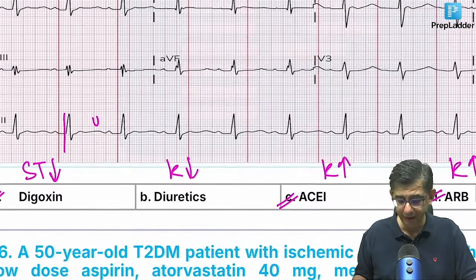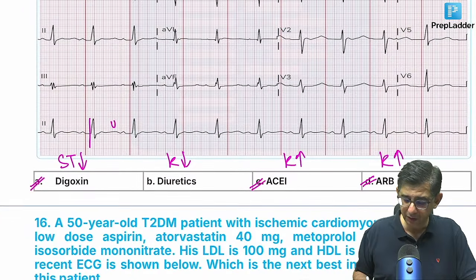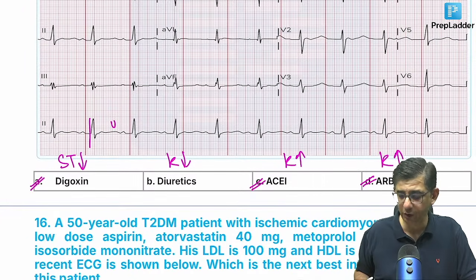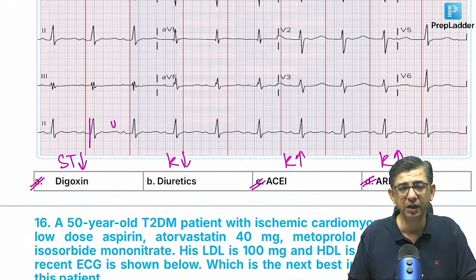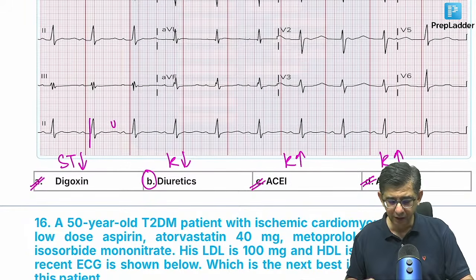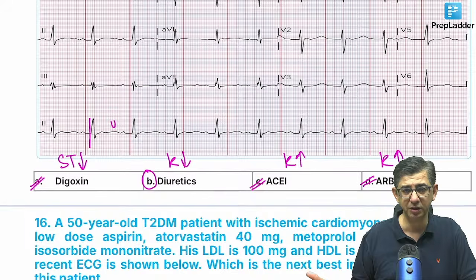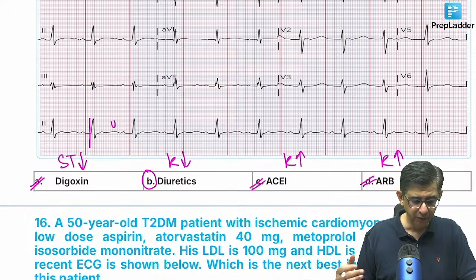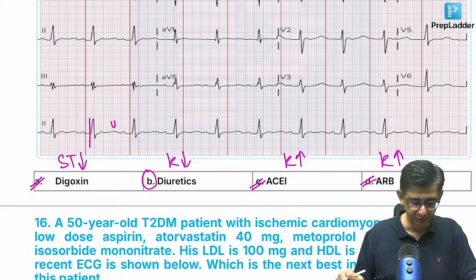then what I want to highlight in this particular question is that आप इसको एक्सक्लूजन से करोगे कि भाई ACE इनहिबिटर ARB के साथ हाइपरकलीमिया होना चाहिए, तो टॉल टेंटेड वेव नहीं मिल रही मुझे, and ST डिप्रेशन और रिवर्स टिक साइन नहीं है. So I go in favor of like the diuretics component, though I'll not say that a very classical U wave is present here and a very classical QT prolongation can be measured, but like there are some of them where you will have to do analytical capability. This is one of them present.